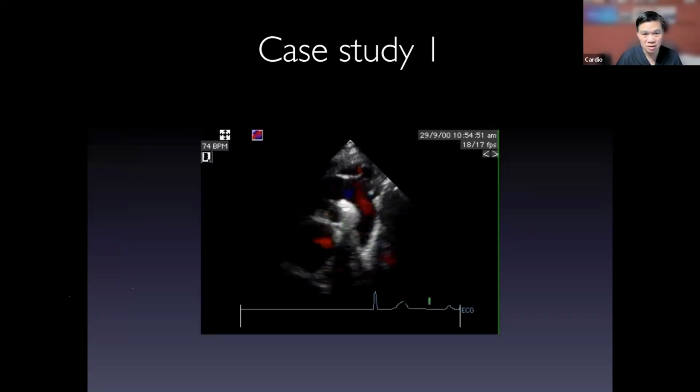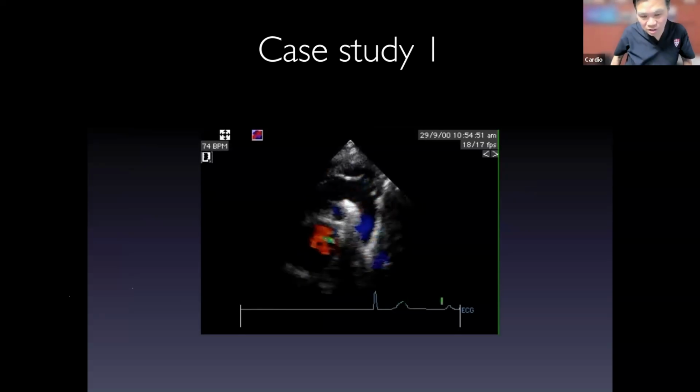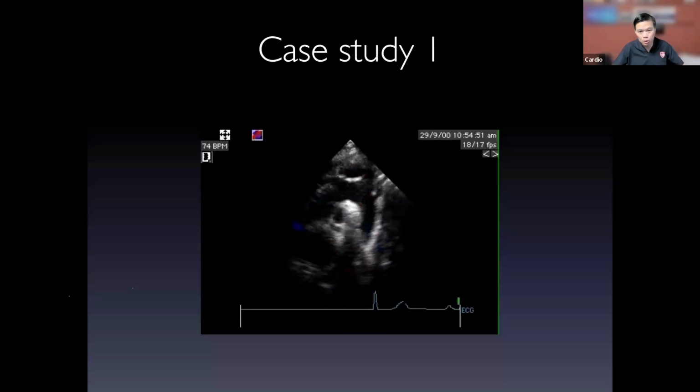Okay, so I need help. Anyone online who can help me? I'm going to look at the chat box and see if someone is actually typing it in. So what are we seeing? Which view are we looking at?